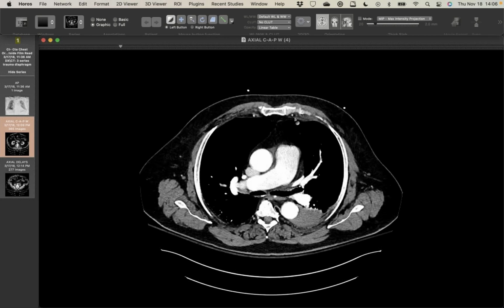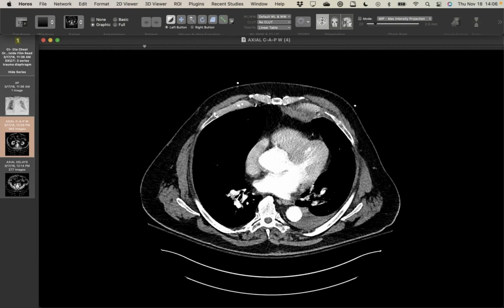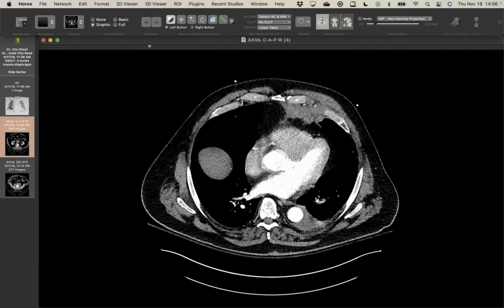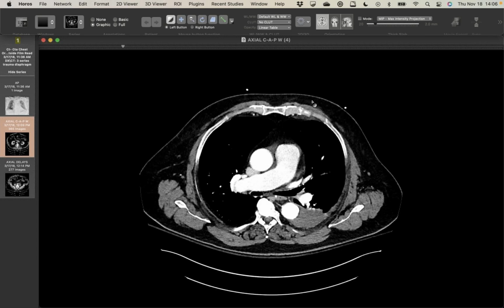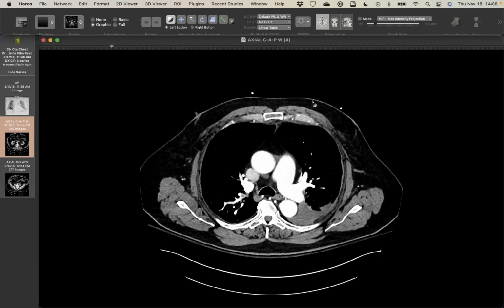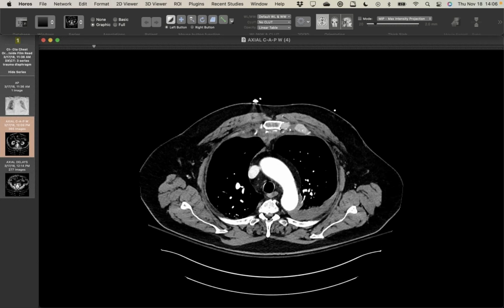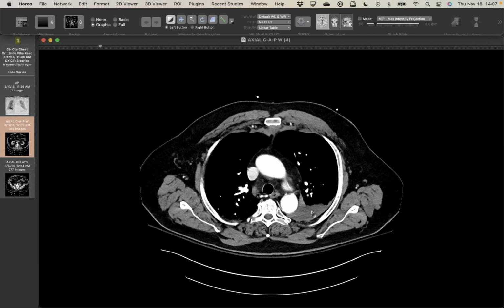You can see there's multiple levels where these are fractured and dislocated, quite a bit down here we can see there. So in my experience with these, we get a lot of trauma transfers from multiple regional hospitals out in rural Wisconsin. And these fractures are often overlooked. And so the clue to me when I first saw this case was the extent of the retrosternal hematoma for a sternal fracture tracking that far laterally, but also the presence of a hemothorax without a clear source elsewhere.